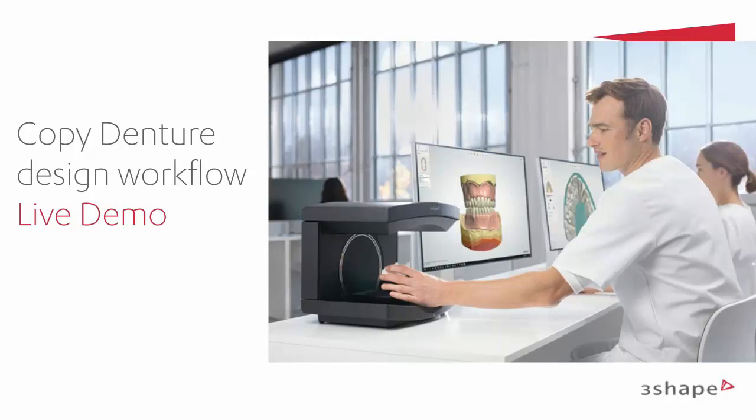There are two fast questions here. Maybe you will show it, but I'm curious about a workflow for dentures on bar, on locator, etc. So basically, what you can do is design the bar first, and then you can do the denture on top of it. Of course, in the perfect world, you would design the denture first and then the bar, but you have to do it the other way around.